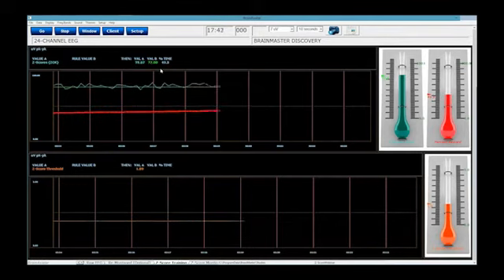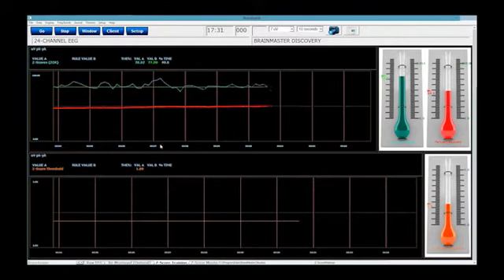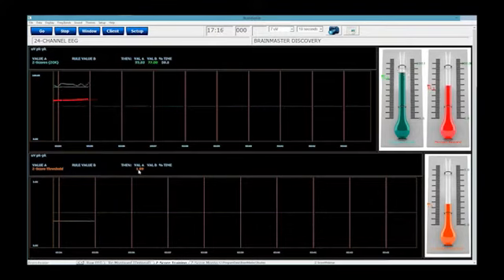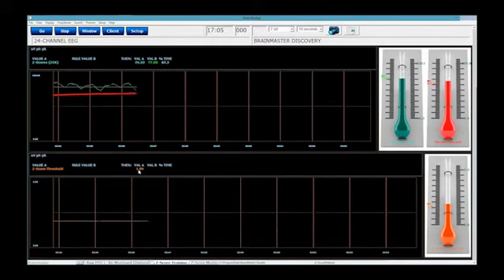Now, you've got to be asking yourself, for those who are very new to Z-scores, how do I know what the percent of Z-scores that are okay is? Where am I getting the threshold for what range I'm looking at? And you're going to get that right down here where you see this Z-score threshold. Right now it says 1.89. What 1.89 means in a PZOK protocol is that it's looking at 1.89 standard deviations plus or minus. So as opposed to having two individually controlled Z-score thresholds like you do in the PZOK UL, which we'll go over next, you only have one. That means one controls it all.